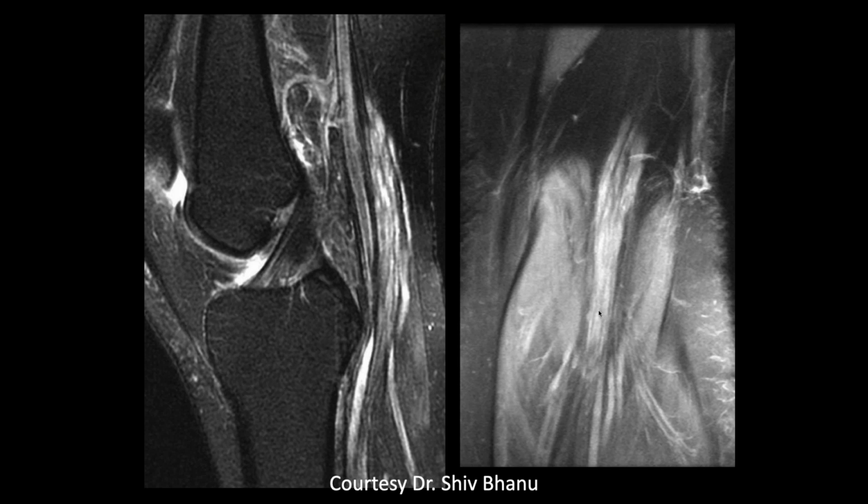So it looks like striations in the muscle, perhaps muscle strain. This isn't really the course of a muscle. The muscles usually come in and either attach. The proximal muscles attach distally here to the tibia. The distal muscles originate here from the femur. This looks like it goes right past the joint space. Same thing here.